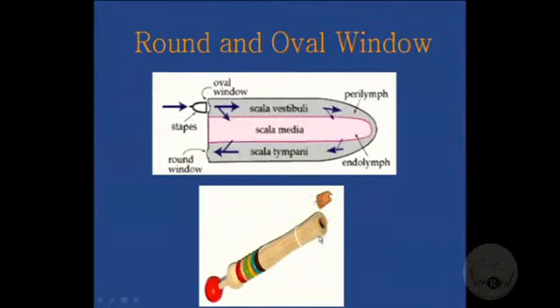So round window atresia. Go back to your schematic, and that's normal. Let me explain the normal. Most of the textbooks keep talking about this image for the round window. That's the round window, and that's a membrane. It's a membrane that just keeps the perilymph from leaking from the inner ear into the middle ear.